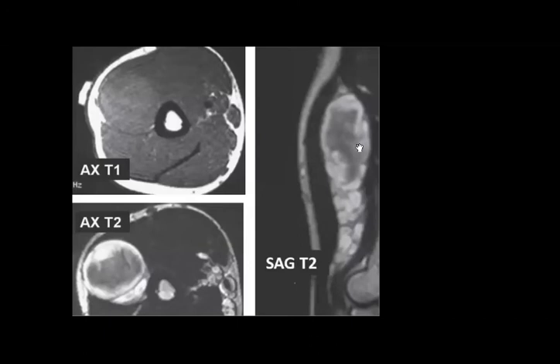And it can be localized or diffuse or plexiform, the neurofibroma. So this one, it could be the plexiform type. And yeah, the age is important, that affects the age group from 20 to 30. As we mentioned, the most important is the target sign, and in this case the multiplicity of lesions is like pathognomonic.